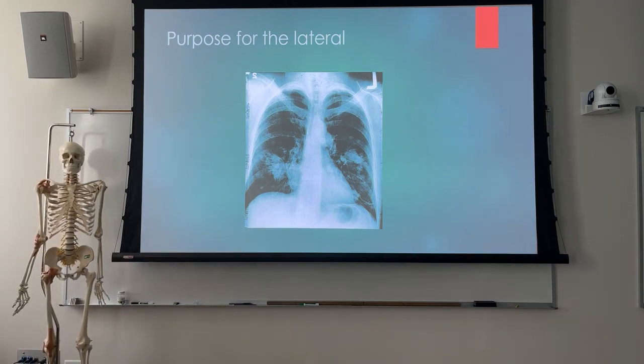positional evidence of where the patient's pathology is. So we've got a patient here, it's got goobers all in their lungs. You got probably cancers, but what lobe is that cancer in? What does it look like? Just looking at this one over here, what does that look like? It's like this on the left, the lower.